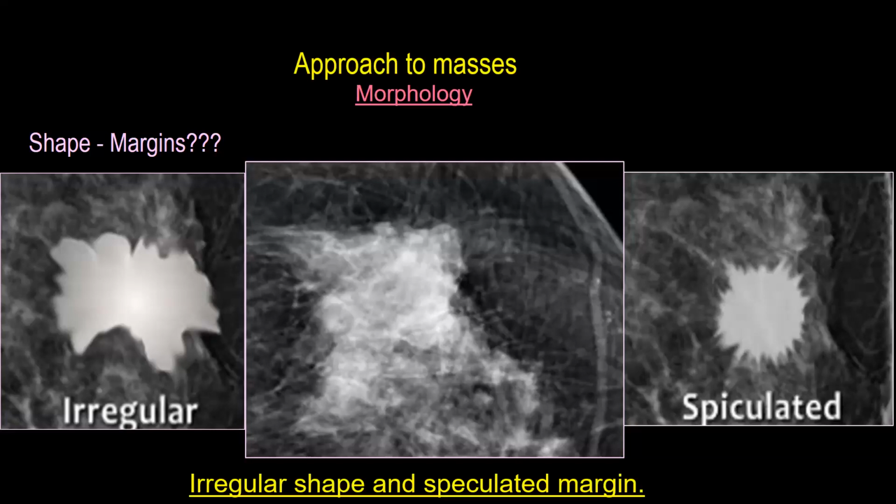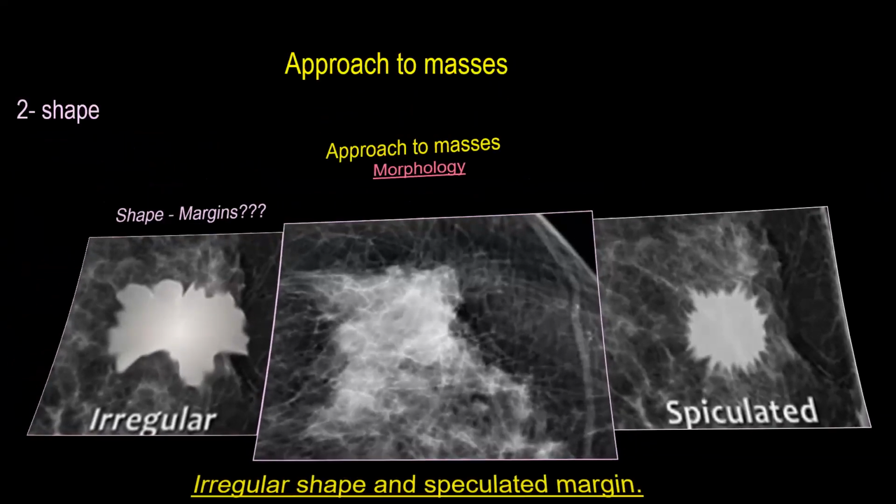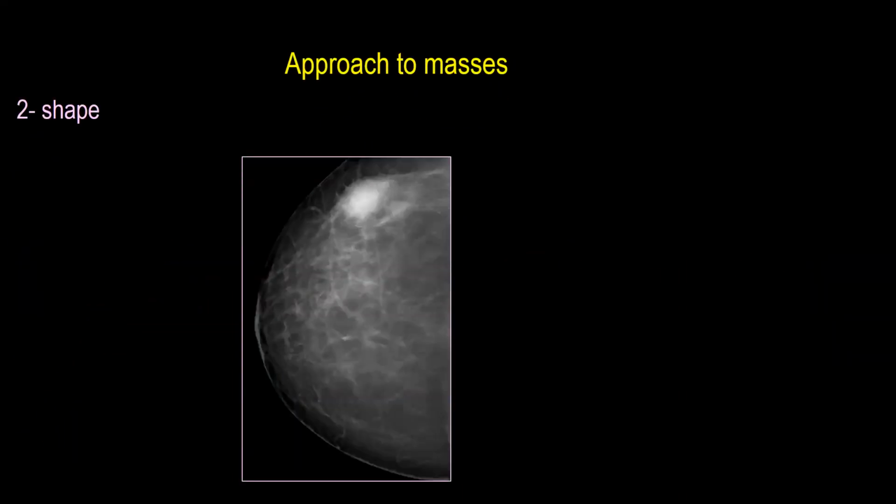But sometimes we describe separately just to emphasize a certain shape or margin. Generally, if you have spiculations, even partially, you can just say a spiculated mass, or you can say a combination of non-circumscribed margin. Sometimes infiltration can occur: part of the mass becomes indistinct, part becomes microlobulated, part can be spiculated, infiltrating by different mechanisms.